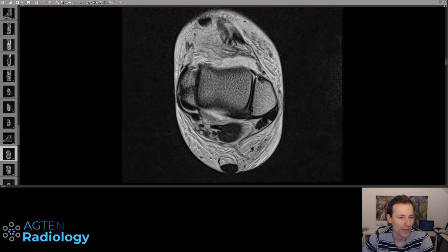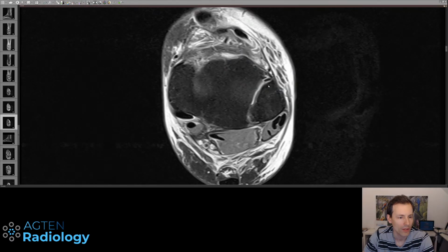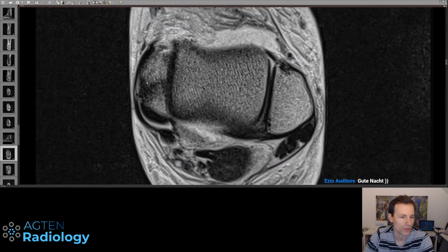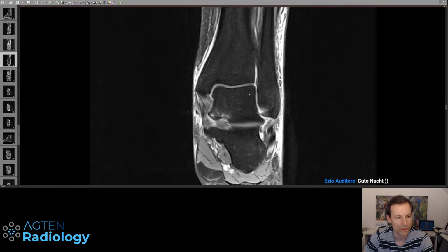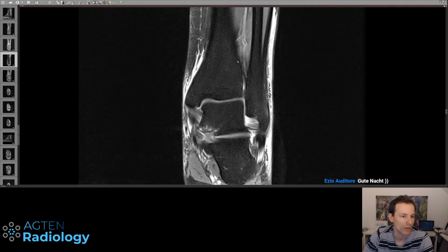Yeah, well, basically the syndesmosis looks normal, normal black signal, hypointense, nothing going on there. And here again, you can see these different bundles, and then here this Bassett ligament, if you will. Posterior syndesmosis looks rather okay too here. We can also check on a T2 sequence, nothing going on. And one good way also to look at the syndesmosis is on these coronals, because you can see these interosseous components that are running down in this direction, right?